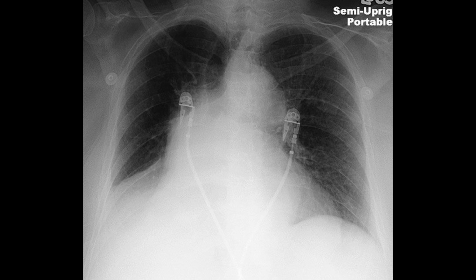This is a chest radiograph of an elderly woman who presented with hemoptysis. The frontal film shows obscuration of both the right heart border and the right hemidiaphragm, indicating loss of silhouette from collapse of the right middle and lower lobes. There is clear evidence of volume loss, demonstrated by rightward shift of the heart and mediastinum. These findings suggest combined right middle and right lower lobe collapse, most likely secondary to an obstructing central lesion.